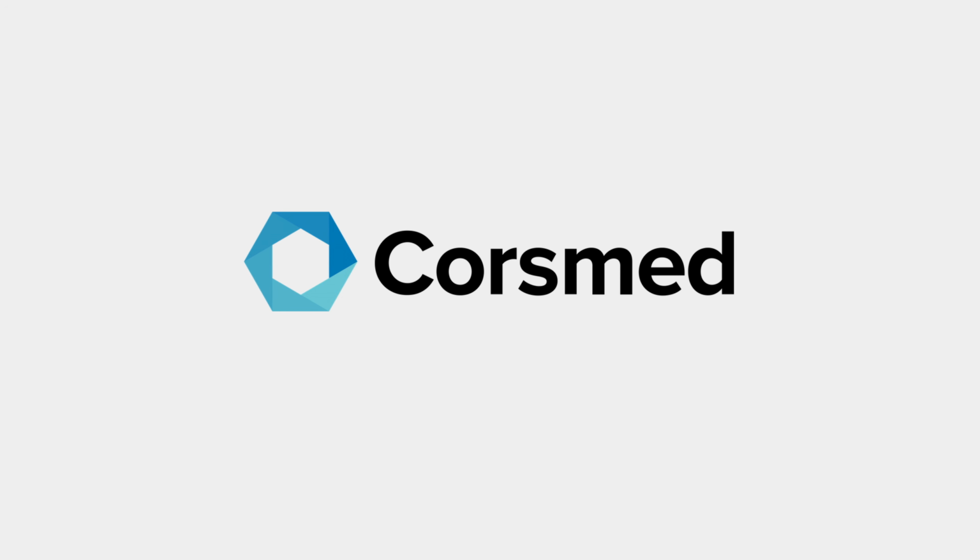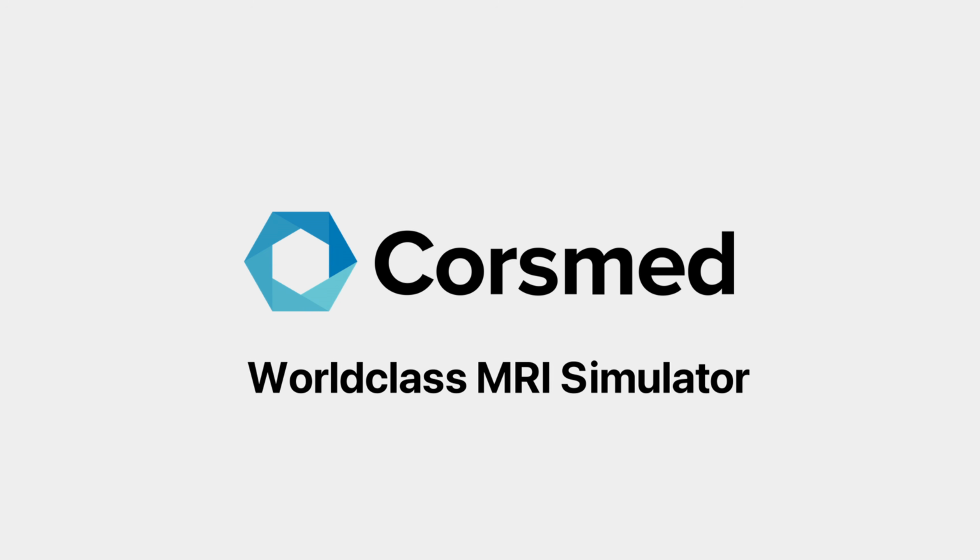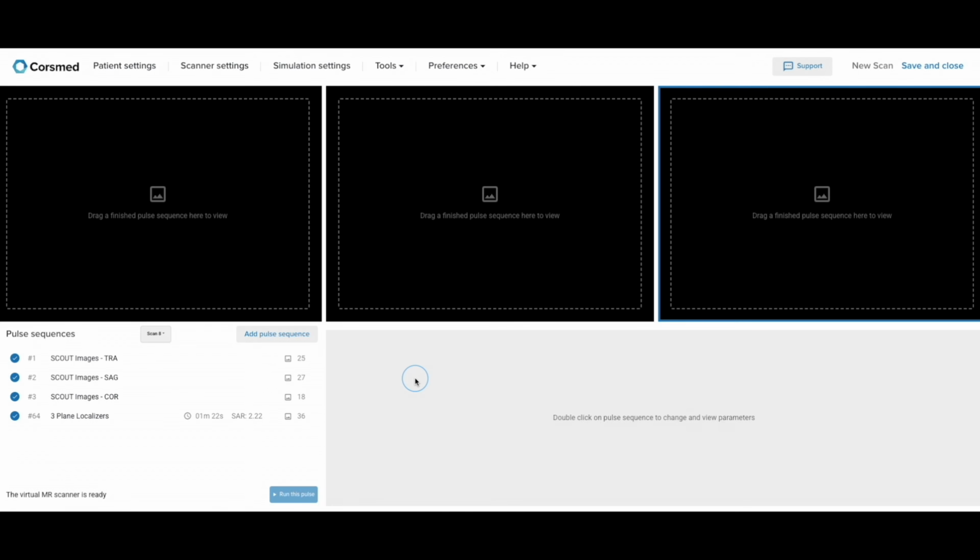In today's video and topic and protocol, we're going to do the shoulder. But specifically, we're going to do the shoulder with the clock face method. We're going to do so start to finish inside the Corsmed MRI simulator. So let's go. Here is the Corsmed MRI simulator, which is the tool I'll use to walk you through the shoulder protocol.